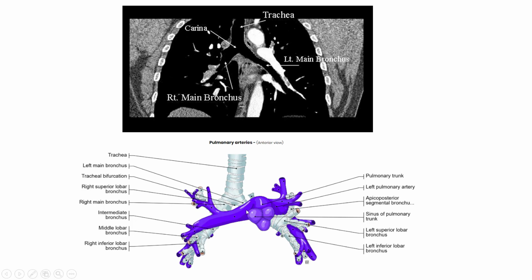And on the right, it runs superior and then anterior for quite a ways. It eventually does wrap around, but it's after it has already bifurcated into other branches here, so it's not really the main bronchus at that point anymore. It runs superior, anteriorly, and then a little superior again before it starts to bifurcate into the other branches.